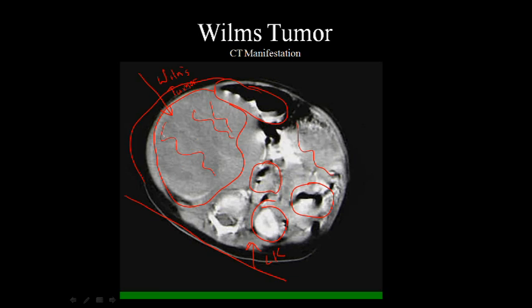And so surely this can be palpated long before it actually reaches the higher stages. Notice it doesn't look like the left kidney is involved, so this definitely means that stage 5 is not a prognosis. We don't really know if any other abdominal structures are utilized for metastasis, but we do know that stage 5 is not affected right now.